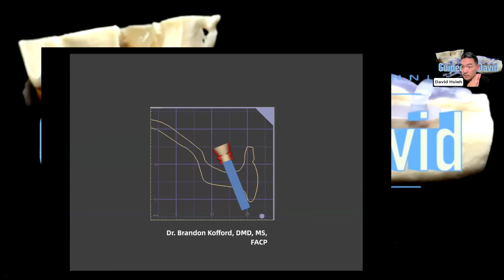If you aim the trajectory for the abutment at about the cingulum, you can see this very nice continuous profile of your prosthesis. So there will be no food trap, there will be no big shelf, right? And the prosthesis won't be that bulky, right?